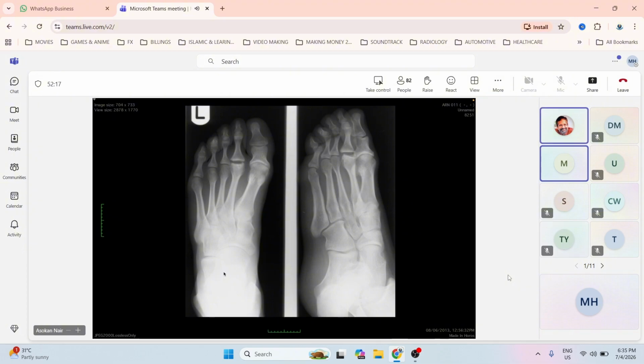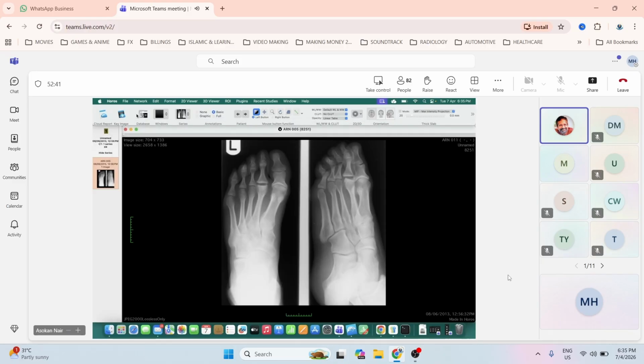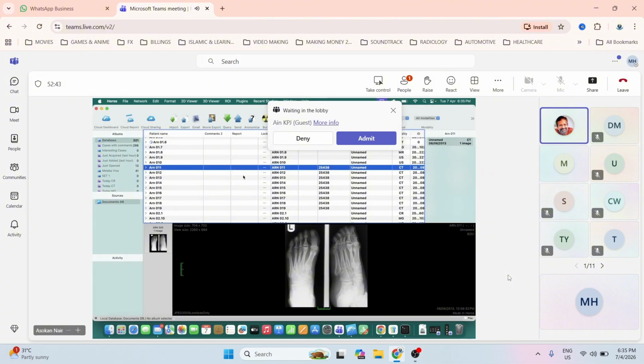Anywhere you get flattening and sclerosis over a joint surface, the pathology that's happening is avascular necrosis. All right, and a lot of places in the body will have this, and they all have a name. So for exam purposes, you need to know all the names. Just go and read what the possible places are that they can ask you.